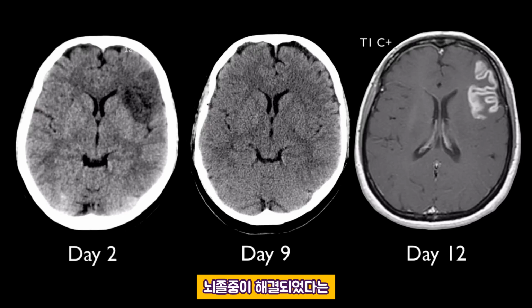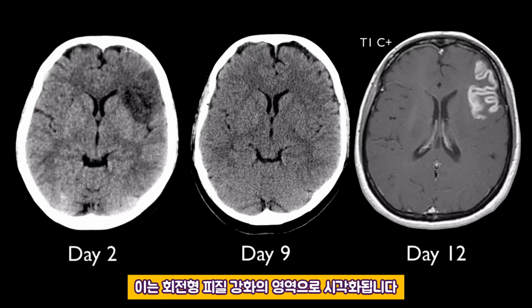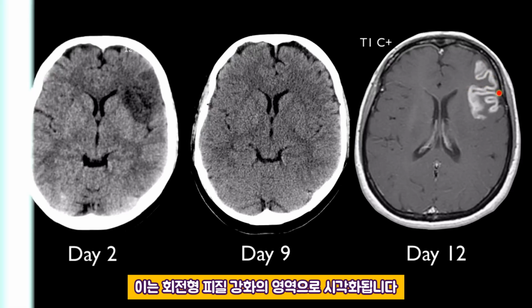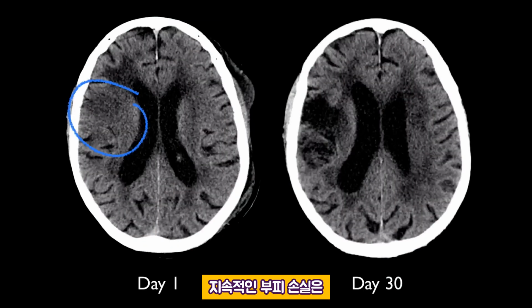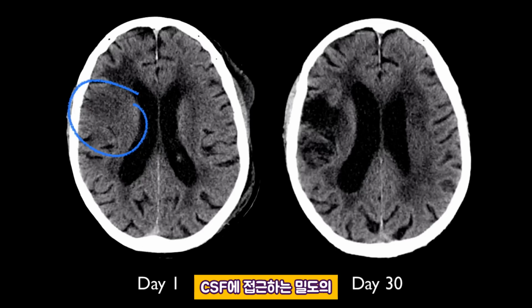Administration of contrast, either with CT or in this case MRI, easily demonstrates the region due to persistent breakdown of the blood-brain barrier resulting in leakage of contrast into the infarcted tissues. This is visualized as a region of gyriform cortical enhancement. Continued volume loss results in negative mass effect on the surrounding brain, seen here as ex-vacuo dilatation of the lateral ventricle, and continued decrease in the density approaching that of CSF.